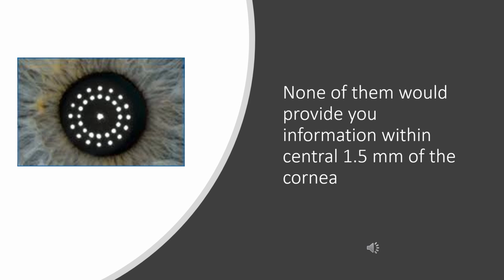That's where the flattest portion for these myopic LASIK patients' corneas is. And if we are not generating our K readings by measuring this area, then we can meet a surprise, right? So if we measure a ring which is at 3 millimeters or 2.6 millimeters, it clearly misses the flatter portion of the cornea for these myopic LASIK patients.